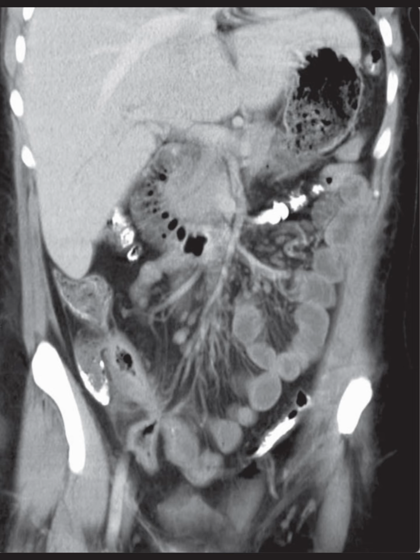It's interesting how the terminal ileum looks like it's adhering to nearby bowel loops, creating this acute angle and cloverleaf appearance in the right pelvis. This suggests a scarring process. In addition, there are enlarged lymph nodes along the ileocolic vessels in the mesentery.